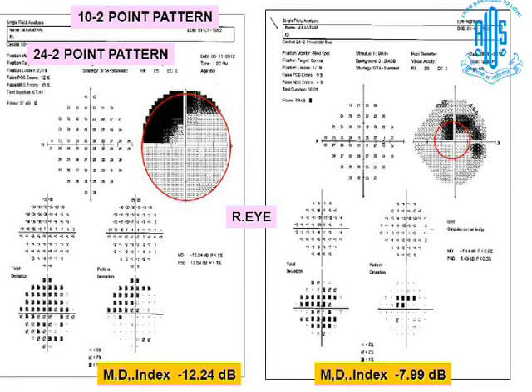If you see it almost coming up to fixation, always see what is the retinal sensitivity value on the 3-degree circle. If it is on the lower side, even if it is 5 or less than 10, you ask for 10-2. If the 10-2 is taken, this means the disease actually started in 10-2 and is spreading outward; in this case the mean deviation is -12. This is very, very important. If you don't take 10-2 and you see only 24-2 in the follow-up test, you assess the progression in 24-2 and you lose the progression of 10-2.